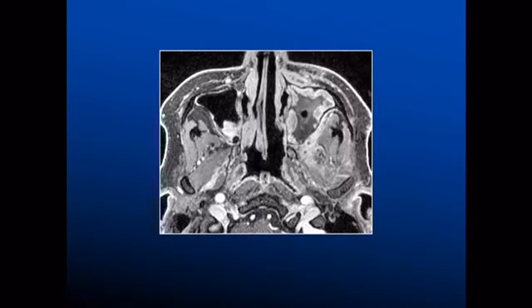And then when you give contrast, obviously there's a lot more enhancement, and it's beyond the margins of the sinus and anteriorly into the premaxillary tissues as well.